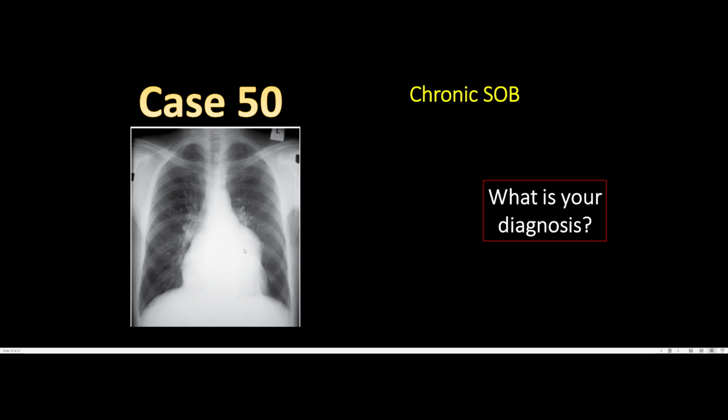So we have a clear-cut case of left atrial enlargement. You can see there's nothing wrong with the aorta. This is the aortic knob, the descending aorta, and the ascending aorta. They're normal. So we have here a left atrial enlargement coming with this appearance.